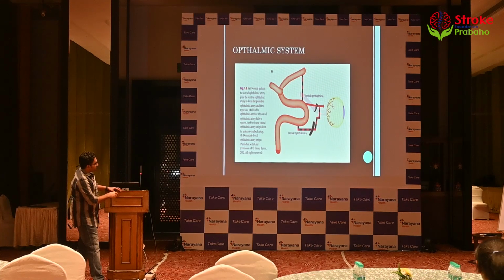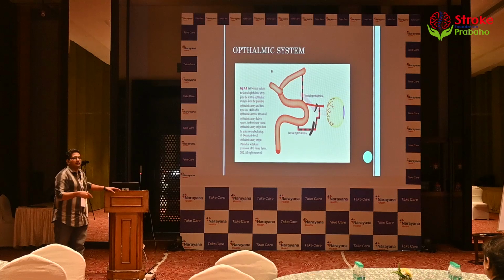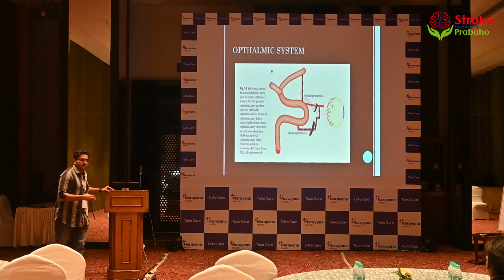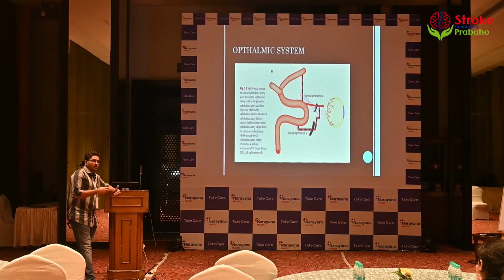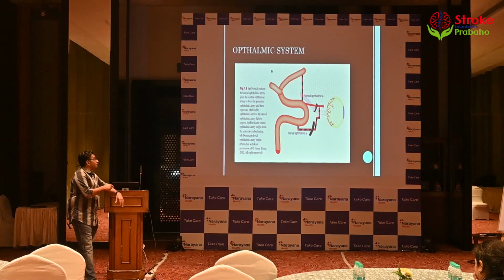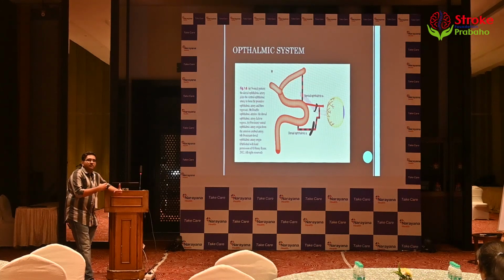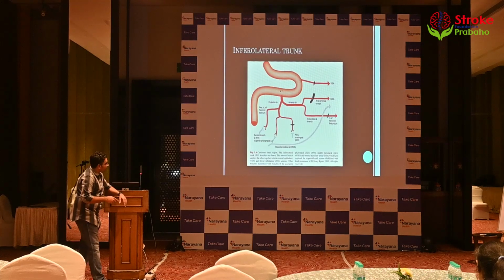So then what happens to the rest? The dorsal ophthalmic and the ventral ophthalmic. Dorsal ophthalmic, how do you recognize that this is a dorsal ophthalmic persistence? It is again through the foramen it traverses. Bone teaches a lot in embryology. If it was the ventral ophthalmic artery, it will pass through the optic canal. If it was the dorsal ophthalmic artery, it will be passing through your superior orbital fissure. So it's simple to differentiate that based on which is the foramen that is traversed.